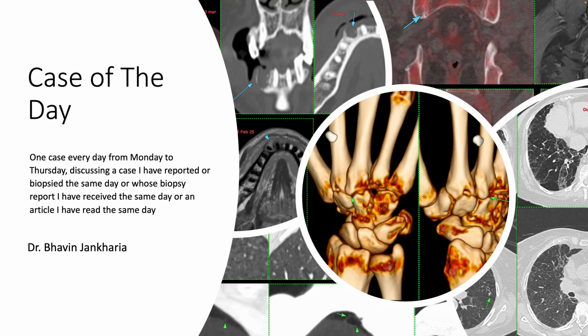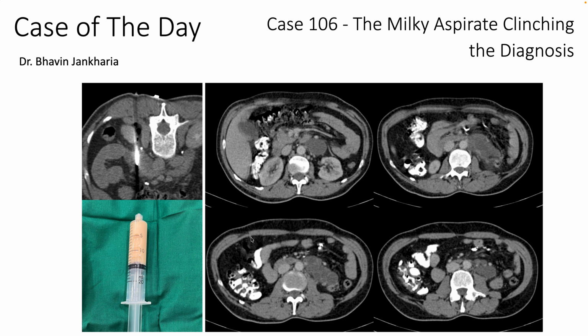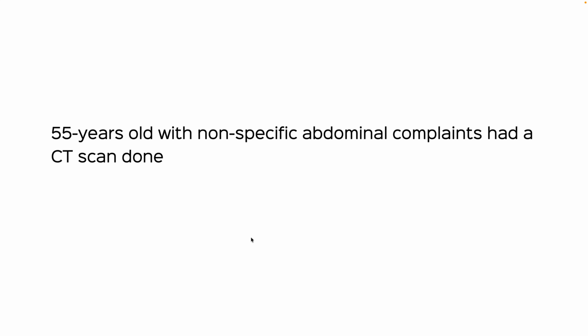Hi, case of the day, another week, and today is Monday, and we're looking at the 106th case, the Milky aspirate clinching the diagnosis. So, this is a 55-year-old with non-specific abdominal complaints, had a CT scan done.